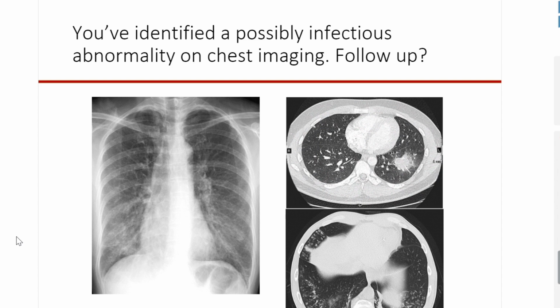But what word would you use to describe those scattered patchy opacities? Would it be reticular? Would it be nodular? Would it be reticular-nodular? Because if you use those words, your differentials start to narrow. Your idea of what this could be, right, really starts to take off.